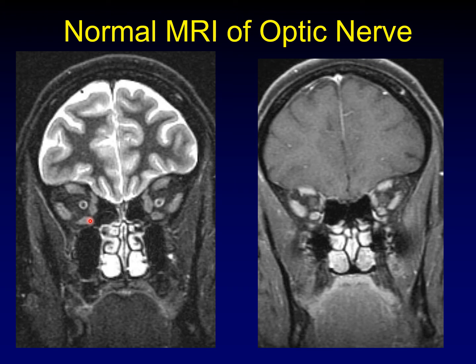Sometimes there's a little less CSF, sometimes a little more than what you see here, but this is sort of average. Notice that the extraocular muscles are well seen here, but they aren't nearly as bright as the CSF, but they're still distinguishable from the surrounding suppressed fat.